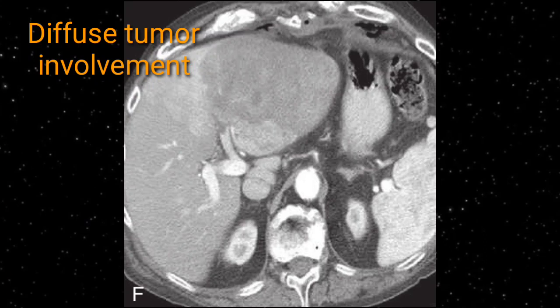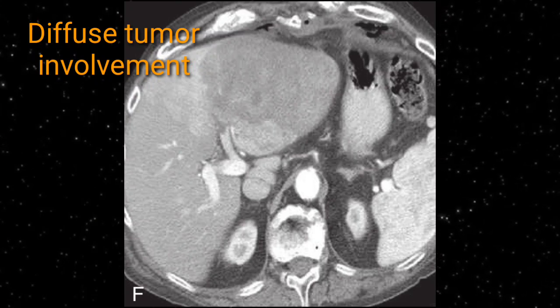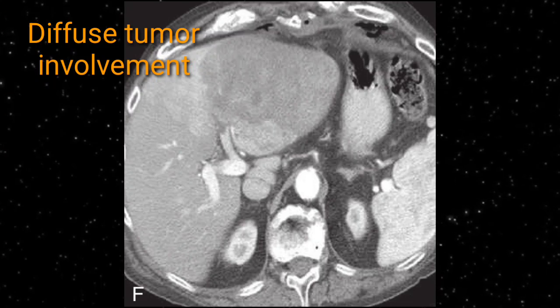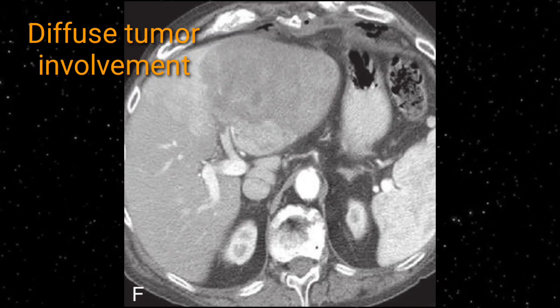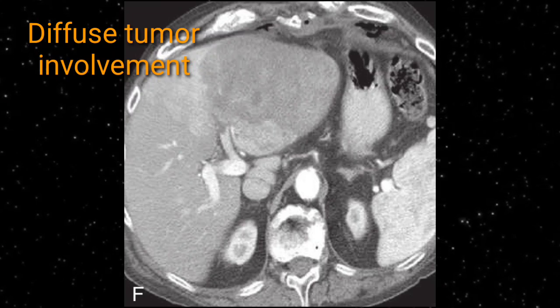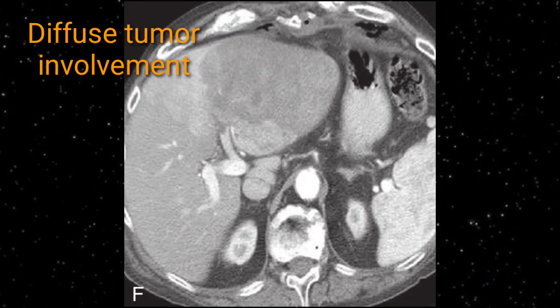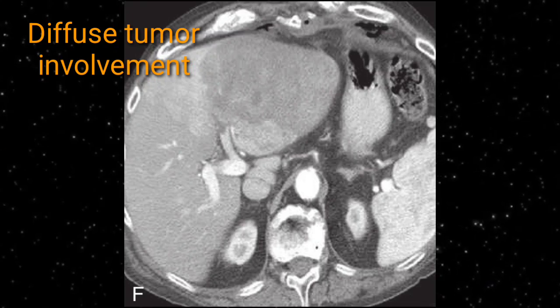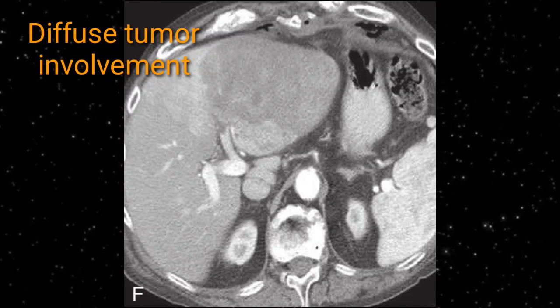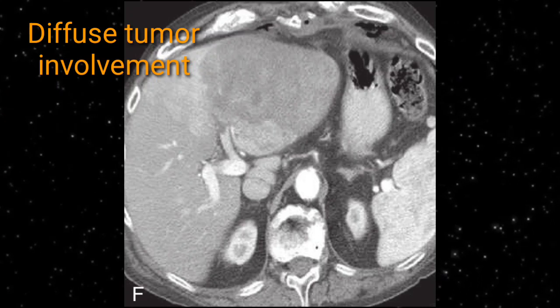Same patient, the CT image shows a well-defined liver. You can appreciate again a diffuse infiltrative lesion, which is almost occupying the entire left lobe. However, this lesion is confined to the liver margin. It is not protruding out from the liver. On the CT scan you can appreciate well-defined margins, smooth and regular. As far as the CBD and portal vein are concerned, they are clearly visible.